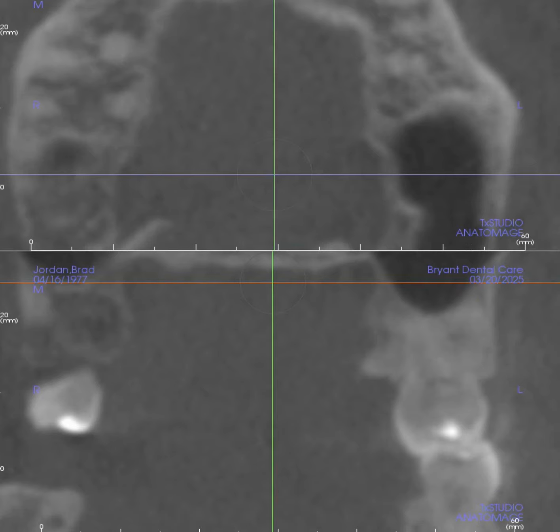Hey doc, it's Nick. You have a case here that involved the patient having some symptoms on number 15. Your endo testing was inconclusive, which is not surprising with these kinds of cases, especially second molars, both on the top and the bottom. You had referred out for a CAT scan, and this is just an analysis of that CAT scan.